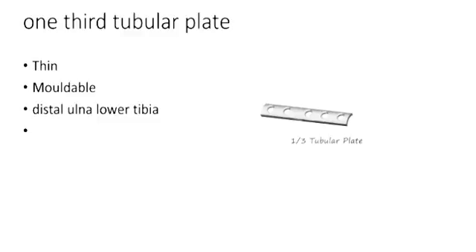Plates and screws, these are used for fixing two bony fragments. Different types of plates are available. These may be heavy duty, broad and narrow plates or semi-tubular plate. Screws may be used alone or in combination with a plate. Different types of screws used in orthopedic practice are shown.